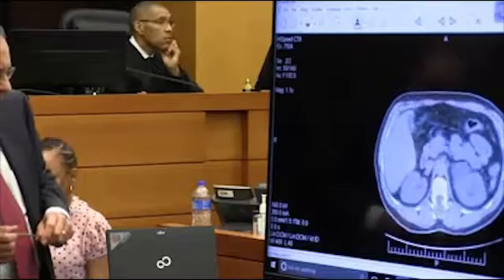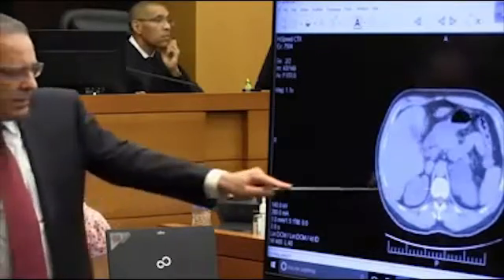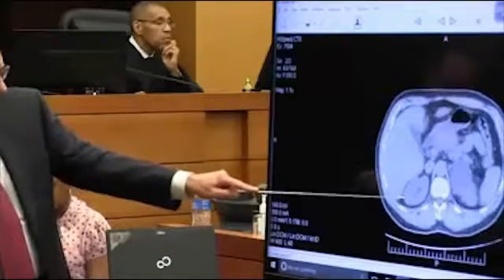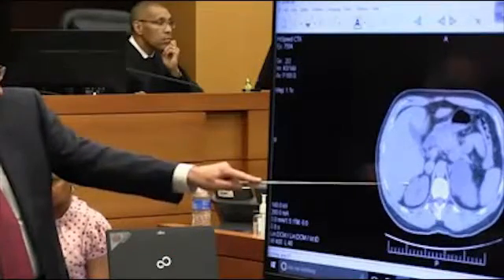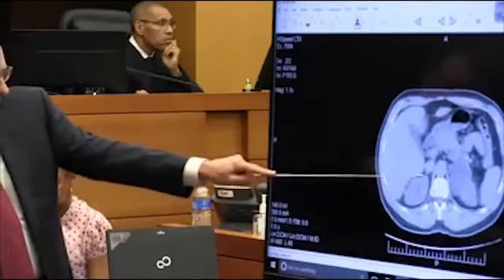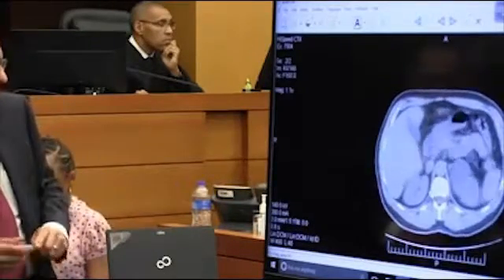If we look at this bottom area of the cyst here, tell the jury what you're seeing happening there. On the right kidney, well, it's here, and it's coming out the edge. I lose it there. Is this... Oh, this. Right. No, that's just part of the normal kidney.